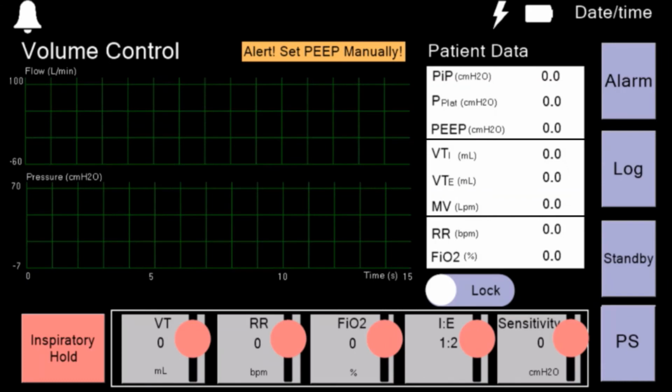When a parameter value is to be changed, the user can easily slide the lock icon and then select the corresponding button. We utilize this lock functionality to ensure that values couldn't be changed by accidentally bumping or hitting the screen. When the button is selected, it will change color and a slider will appear on the right-hand side of the button. Simply utilize the slider to select the correct value, and after that is achieved, slide the lock icon to its original position to lock in the value.